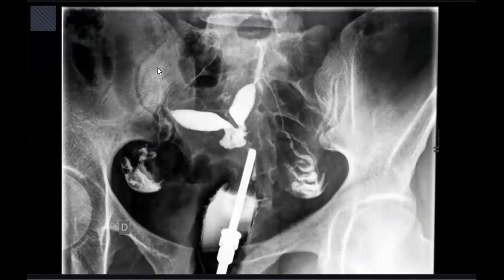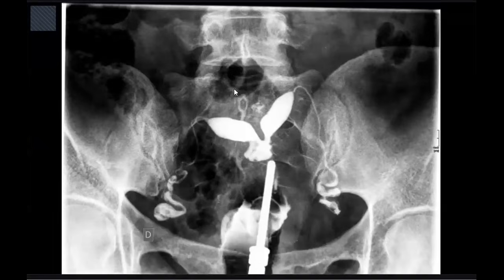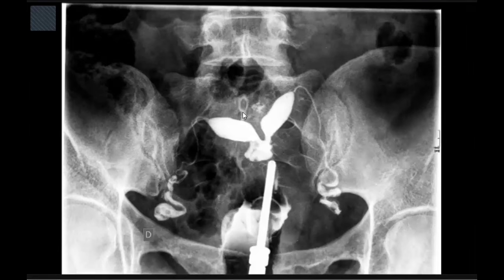This patient is a 35 years old female patient with infertility and a history of ectopic pregnancy. You can scroll through the images. Okay, these are hysterosalpingogram images of a female patient who presented with a history of infertility and previous ectopic pregnancy.